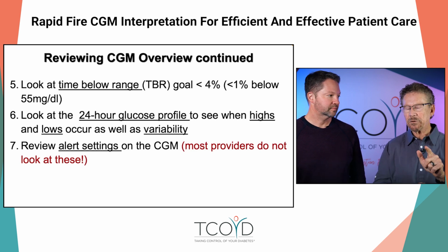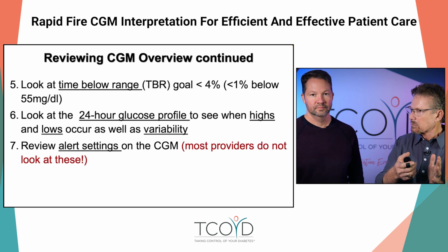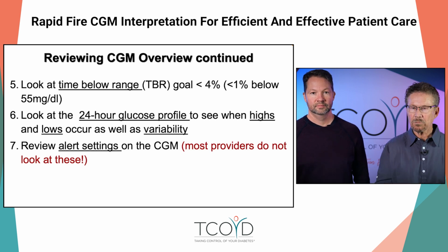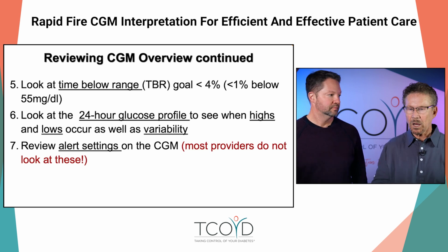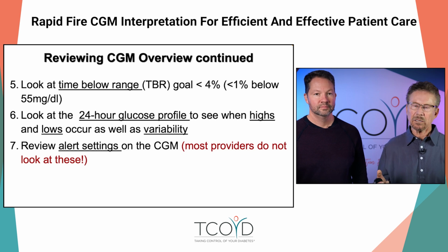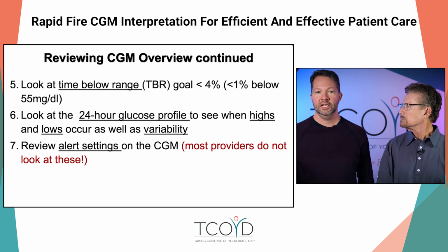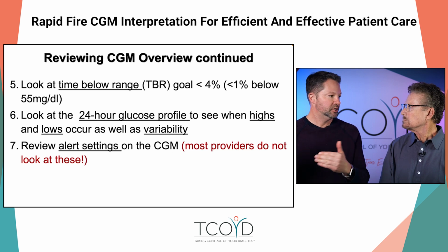Now, most providers don't look at this. I was in clinic this week with one of the fellows, and the patient's blood sugars were just high across the board. And I said, what were the high alert settings? And they said, oh, I didn't even look at it. And it's important to know that alert settings are completely independent from these time in range settings.